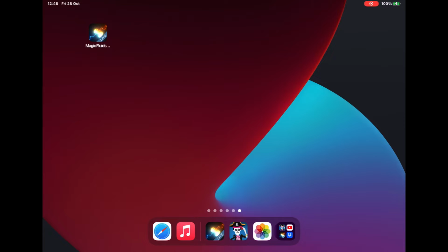Hi, I'm Dan. I'm a speech and language therapist in London, and in this video we're going to create an Apple shortcut to be used with guided access. Guided access is an Apple accessibility feature that you may want to use with certain apps, and by using Apple shortcuts we can automate this whole process.